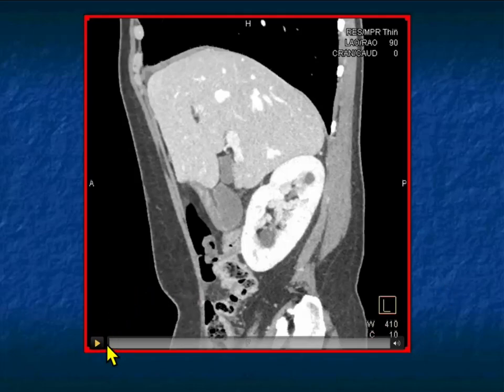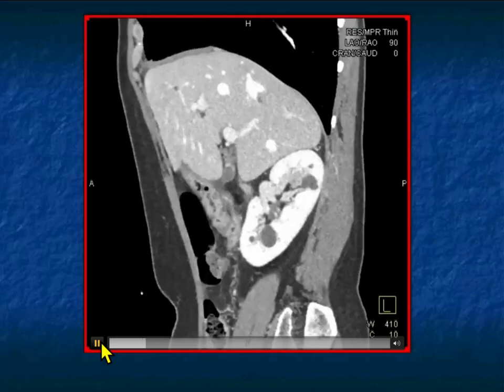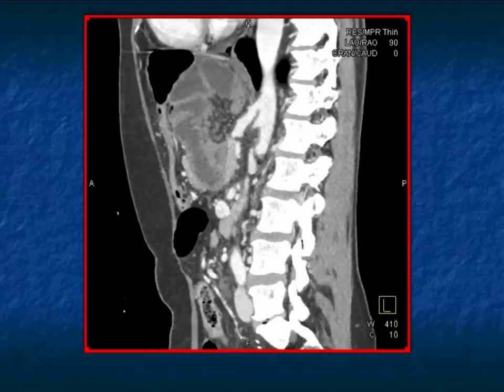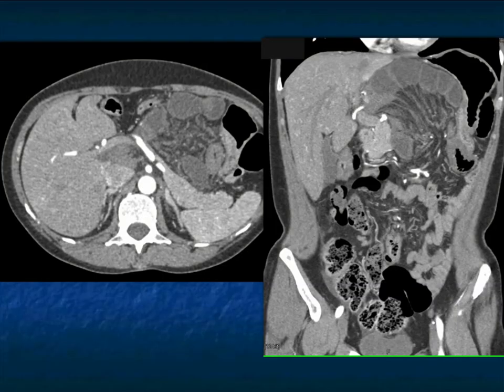Again, you want to look at it a third time. Here it is very nicely looking at the sagittal view, and you can see the bowel loops really sitting nicely in the patient's lesser sac, pushing right against the celiac and the SMA. And here it is, just two snapshots. Again, lack of bowel enhancement, dilatation, but also the vasa recta show a haziness and then not as bright as it should be because you have lack of flow. And that's that twisting phenomena.